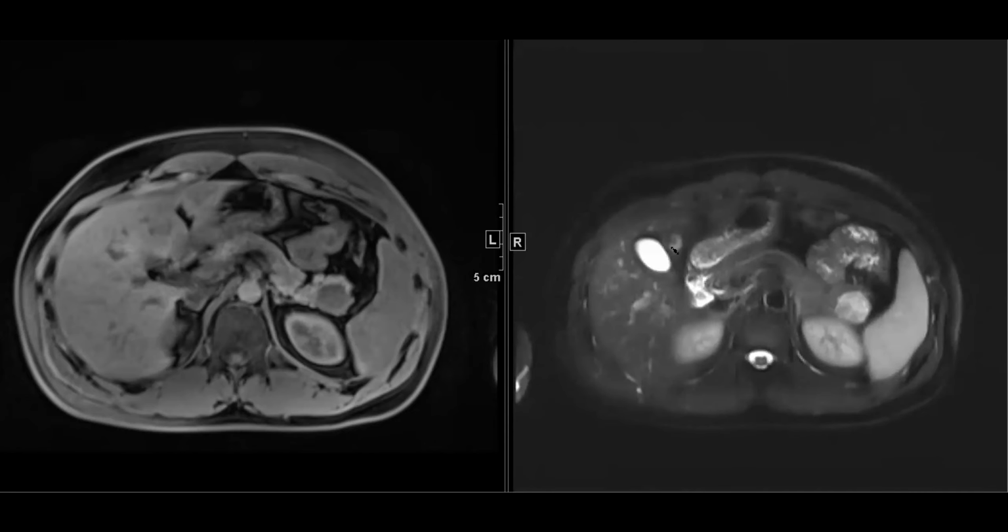Be a cystic neuroendocrine. Good. We also brought up maybe a torsed splenule because it was a little bright. But they got a spleen scan, it did not light up. Anything else?